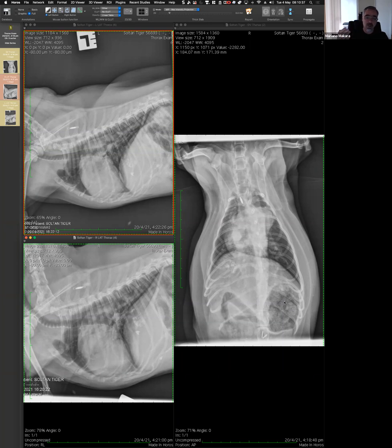So one of them is in a dyspneic dog. If we are dealing with a small pneumothorax, the impact of that information is not going to be so much in a mechanical issue. It's going to be like, well, now we need to think about possible causes of that pneumothorax. So now the list is going to change. So it's a small finding with a possible very large impact. Okay, we leave it there. I probably don't think there is pneumothorax, but we'll get back to that.